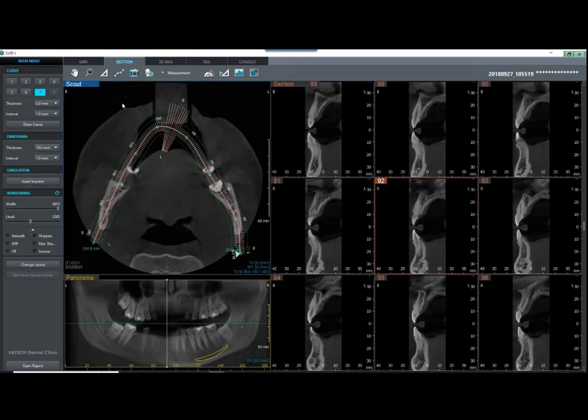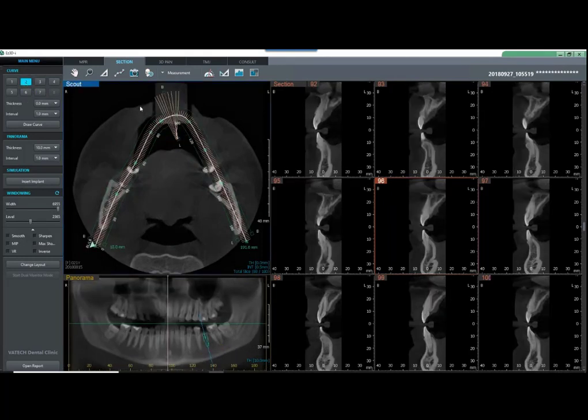Now notice your annotations over here of orientation. We have our spotlight of our right side and our left side. So you can draw it however you would like, but if you want your orientation to be what you're used to seeing on your panorama views, I'm going to draw it clockwise to give us our right side and our left side on there. Pretty good? Okay. Yeah, looks great.